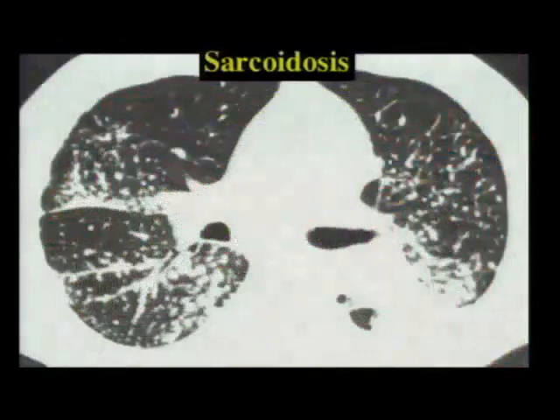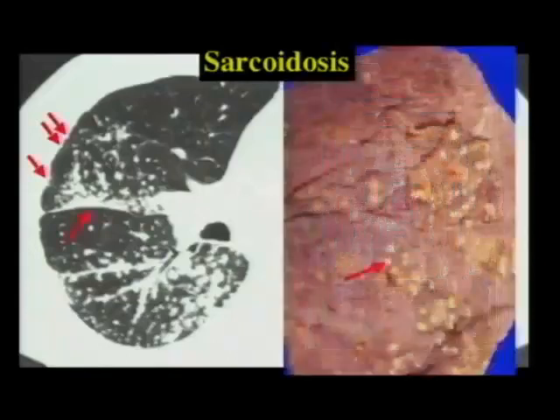Here a very nice example of sarcoidosis on high res. This is case number 1. What we see are numerous nodules contacting the pleural surface, arising at the pleural surface peripherally and arising at the pleural surface in relation to the fissure, a very, very typical appearance, typical of a perilymphatic pattern and typical of sarcoid.